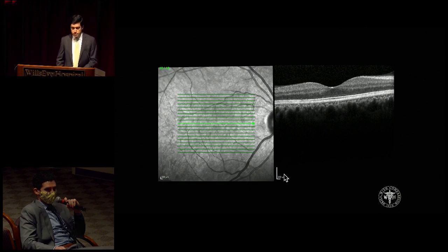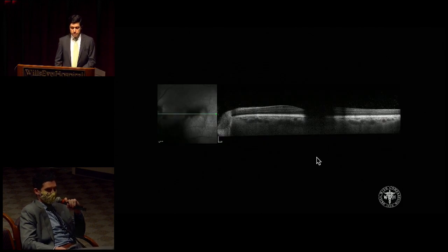And again, the regular horizontal B scan through the fovea in the right eye shows normal retinal lamination patterns throughout. And an EDI scan through the fovea of the left eye, again limited by some shadowing artifact, presumably from the vitreous opacities, shows a normal choroidal thickness, and where visualized, the retinal lamination patterns appear to be intact without disruption. There, you can see there's probably some vitreous opacities here, more noticeable temporally.